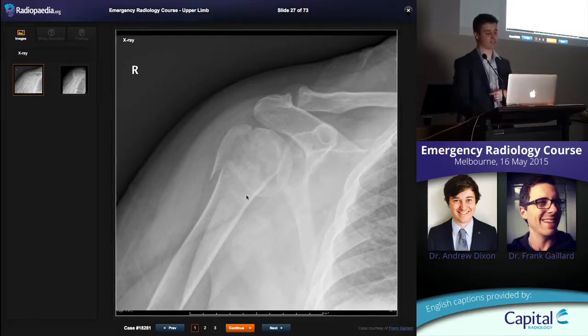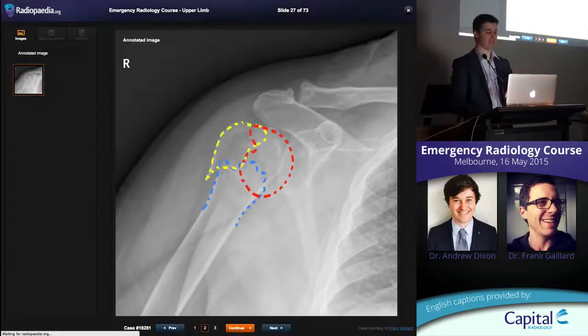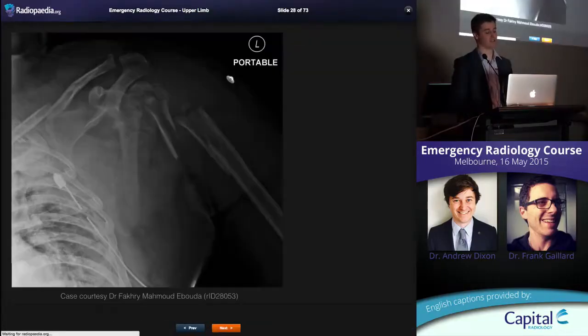Okay, so this one's not that displaced. Nothing's really away, so that's just a one-part injury, even though the fracture is in multiple parts. Does that make sense? It doesn't make sense to me, so it shouldn't make sense to you. It's a very confusing classification system.